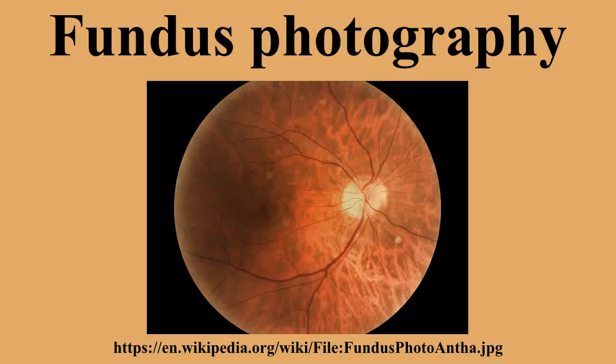The light reflected from the retina passes through the unilluminated hole in the donut formed by the illumination system. As the light paths of the two systems are independent, there are minimal reflections of the light source captured in the formed image. The image-forming rays continue towards the low-power telescopic eyepiece.